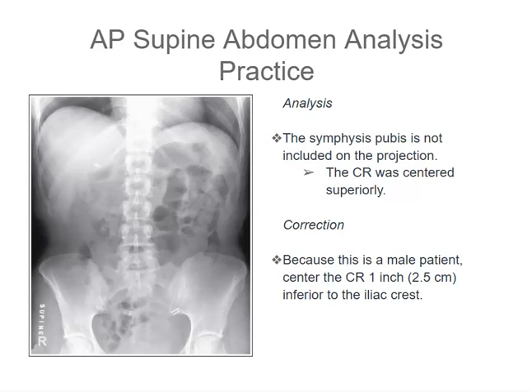So the shift in the non-symmetry in the pelvic wings could be pathological. Would I send this image in? Well, yes, I would send this image in.